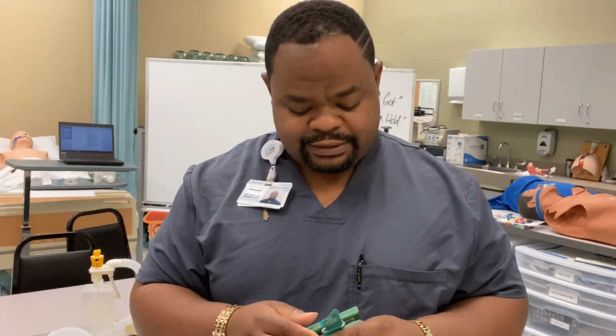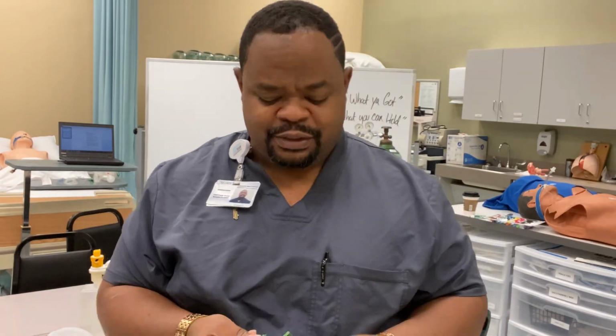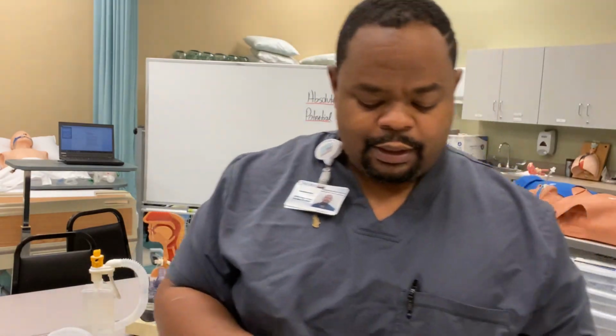Now, you'll notice when you get to clinicals that some hospitals do not put heat on their aerosol devices for germ reasons, right? Breeding infection and germs. So they just don't do it. Some hospitals do it. I know that Regional 1 chooses not to because they want to keep down the infection rate. They don't want to breed infection and germs with heat. But NBRC wants you to heat and humidify the gas, all right?